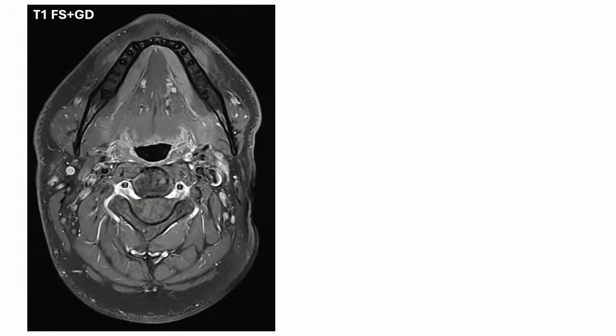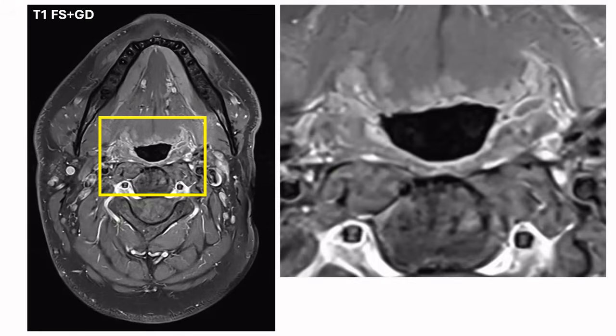And this is a T1 weighted image of the head and neck at the level of the oropharynx. It is a T1 weighted sequence with gadolinium and fat suppression. And if we magnify the oropharynx a bit, and we're going to talk about the exact anatomy in detail later, but this is just to illustrate the structural organization, we can actually discern the various layers of the pharynx. The innermost enhancing part is the mucosa or submucosa, and as said, the pharynx is basically a half-open tube.